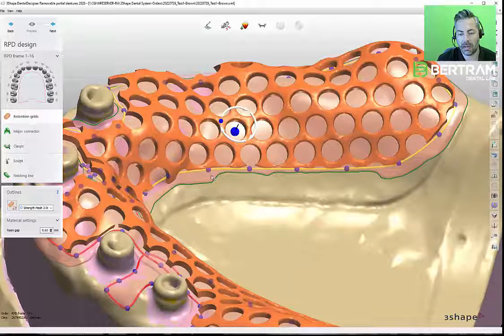It is a little laggy, especially when you have a really big piece of mesh. So it is a little time consuming. Again, if you're being very particular in how you want this done, you can bring this up. And I'm going to bring this up on this one because it's a really good example to show you how to adjust this. Again, you have to be hovering where you're hovering with the mouse. You can see my white pointer here, and I'm scrolling with the scroll wheel while holding shift and bringing that resin gap, or sheet relief in the analog world, to the edge of the mesh.